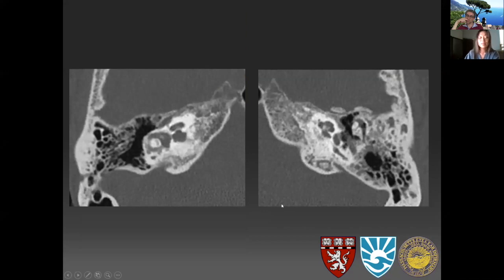All right, so here's another companion case. That one was otospongiosis. Now this one looks kind of messy. You see these areas of hypodensity? They're not really following any geography. Some of it maybe is around the cochlea, but it's a little bit more extensive. And also the ossicles might look a little bit demineralized.